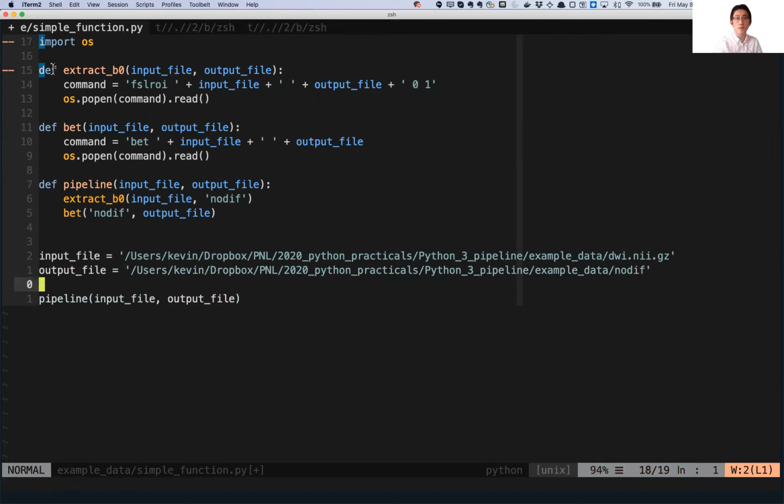So I'm building two functions, and I'm creating another function that merges the other two functions in order, and I'm running that here. I want to save that, :w. You can run in NeoVim or whatever else. I would just go out, :q, wq, save and exit.